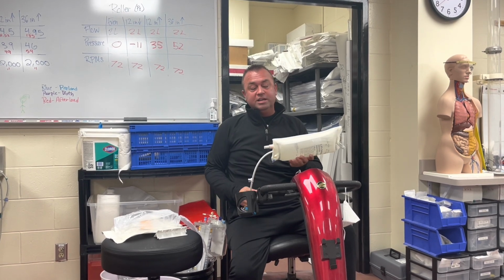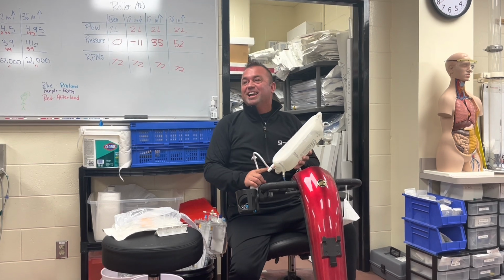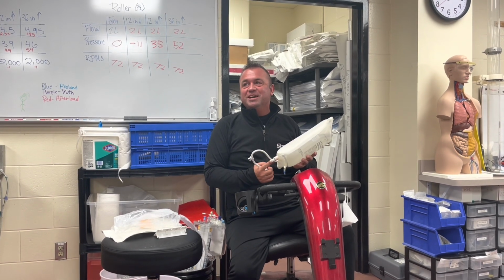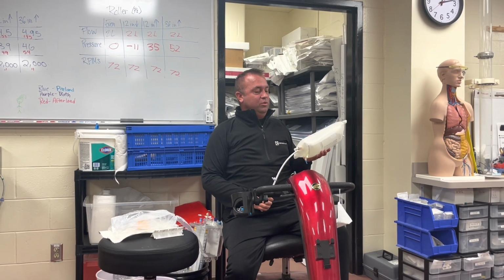See, number one, well, guess what happens? Guess what comes after green? Red. Can you see it in there? That what comes after green is red. What's another thing? What do you think?